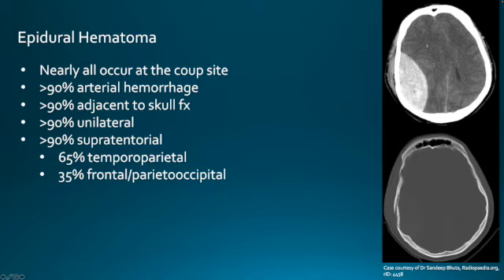There's actually sulcal effacement within both cerebral hemispheres. There's effacement of the right lateral ventricle, and there's also midline shift. You can see the subfalcine herniation here. Also on the bone window from the same plane of section, you can see that there's a mildly depressed comminuted skull fracture, which classically goes along with these epidurals.